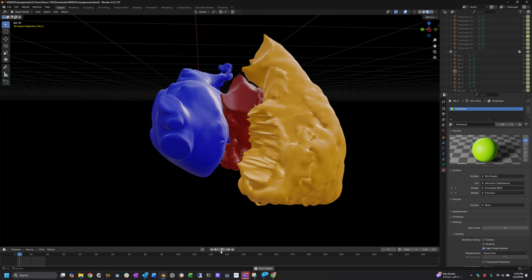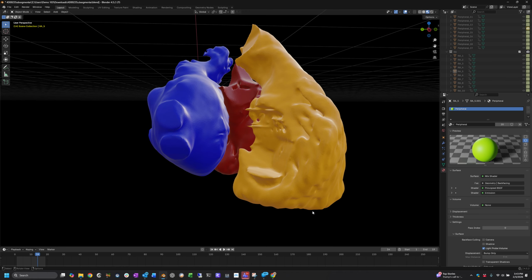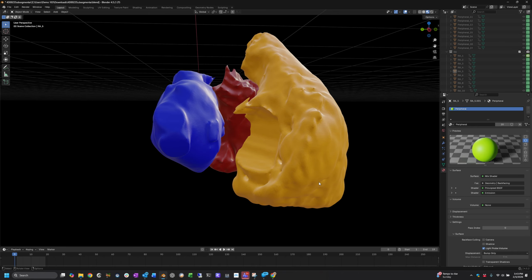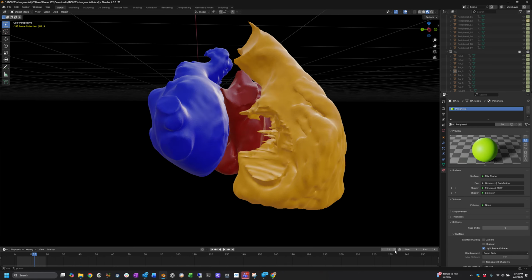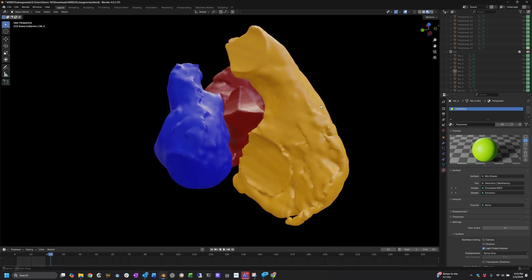There's obviously, now I know that there were some where the contrast was not very good, and I bet that's what we're seeing in some of this. But I think the borders for the tricuspid valve are actually, I think the methodology is working very well.